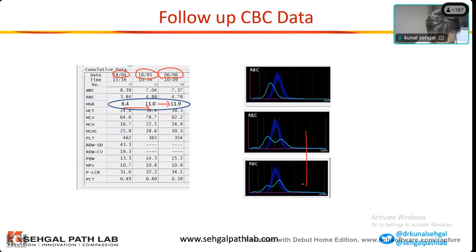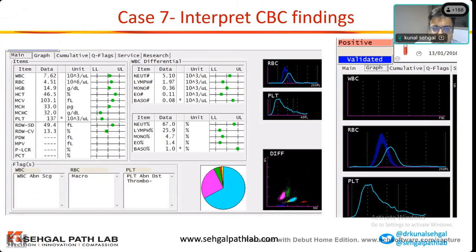Dr. Harini, can you tell me what's the difference between these two histograms? This is the month of May, this is the month of June. What has changed? Sir, in the second one, the microcytic curve was less and the normocytic curve is more. Correct. As hematinic therapy is happening, exactly what I showed in three part. Any difference between the concept of a three part and five part? Nothing, same, sir. Similar scenario, but we are focusing only on the values and the flags and not on the histogram. That is the take home lesson.